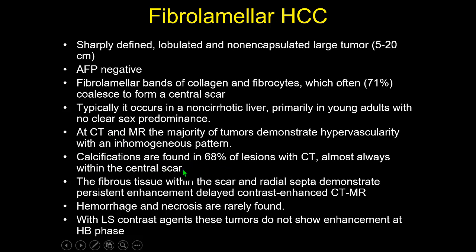And when we do CT, in about 2/3 of the patients, we see calcification in the central scar, which is fibrotic, so we see just coarse calcification in the desmoplastic reaction of the lesion. And as the scar is fibrous tissue, it can take up the contrast agents due to pooling. So after 3-5 minutes, it can take up even for 10 minutes. So this is another typical sign of this lesion.